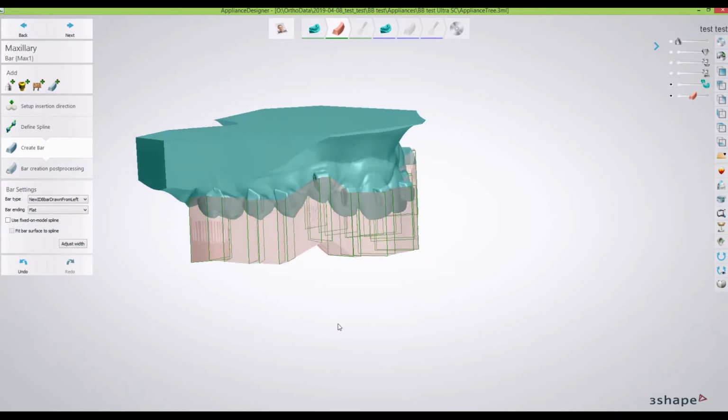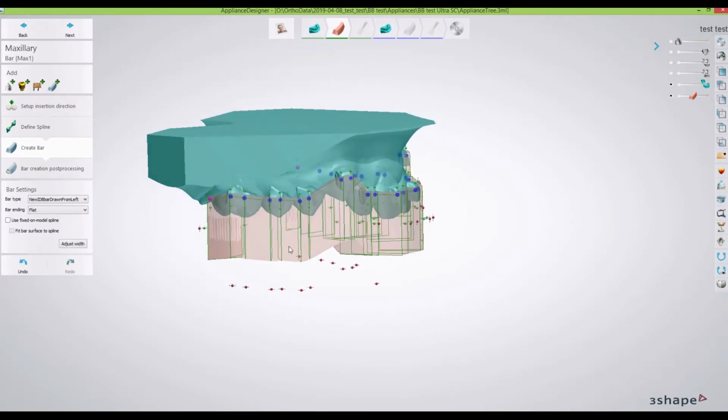Now, next thing I take a look at is how high up. I need to cover half to two-thirds of the bracket. I don't want to cover the whole bracket, because remember, we want to insert directly down into that bracket. So we're going to need an opening there. If you happen to go up too far, what will happen is your tray is going to start to be inside that bracket, and it's going to make it harder to insert.